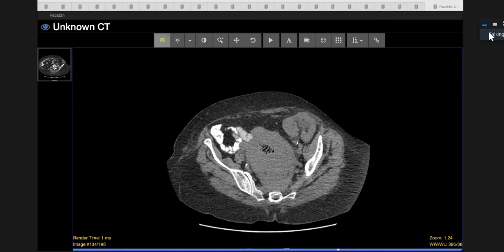You can get pancreatic cysts, you can get liver cysts. So that's what they are. They're liver cysts, and the renal transplant proves that they've had a renal transplant there. And then you'll know clinically that they'll be put on a whole host of quite strong medications, one of them will be immunosuppressants, and that can lead to increased rates of lymphoma. And that's what that thing is in the rectum, because it has a very uniform kind of exophytic appearance.